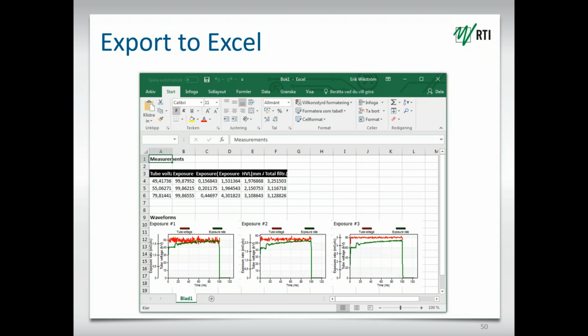So if you have old Excel templates, by clicking that option, you can export your data, and the format and the order of the data will be the same. So you can reuse those templates to quite a large extent. From this landing sheet in the workbook, you would then link it to your templates directly within Excel. Do that once, and that would be it.